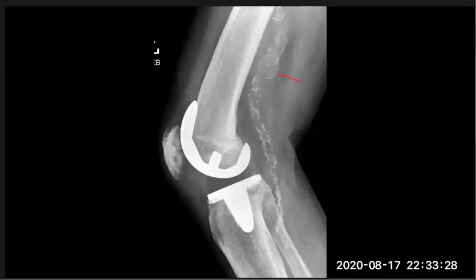Where's the calcification? Mural calcification. Which layer? Intimal. Are you sure? If it is intimal, it will cause narrowing of the lumen, right? Right, because it is atherosclerotic changes.